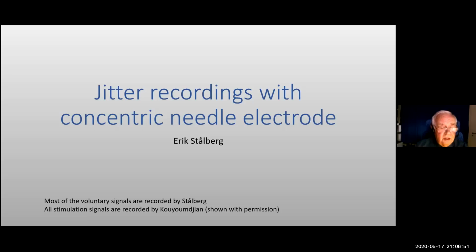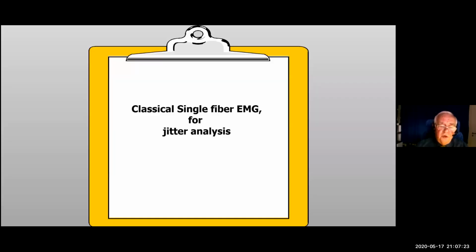In EMG, but now we have chosen single fiber EMG as a topic, which I developed together with my colleague Ekstedt in the early 60s, and I wrote a thesis on that also. Some of the recordings here are made by our colleague from Brazil, who has been working with me for some short period. So here we shall first discuss a little about the principle of single fiber EMG and jitter analysis.